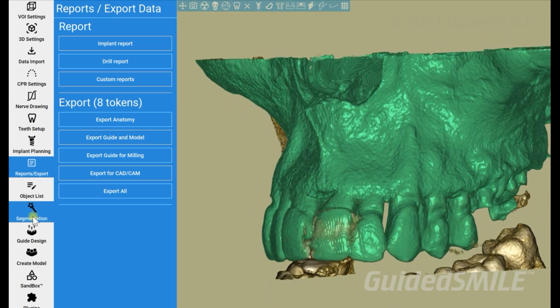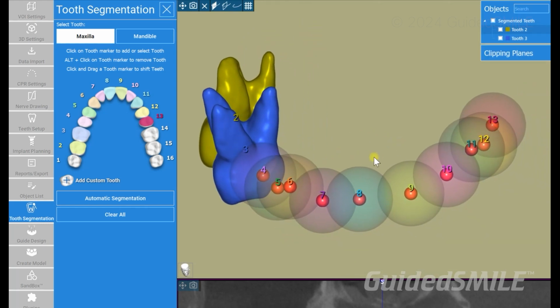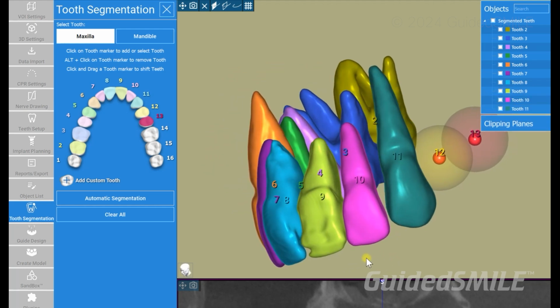And then you can also, if you wish, depending on the use for this, a little bit more advanced, take your STL file that you've imported into the software, the STL file that has the teeth, the actual teeth or crowns, and it will separate the clinical crown now on the STL file and merge it with the root in the STL file. This is for making temporary restorations. This is to help get rid of scatter and visualization. It's really a neat tool. When you start playing with it, you'll hardly want to do a case without doing some type of segmentation.